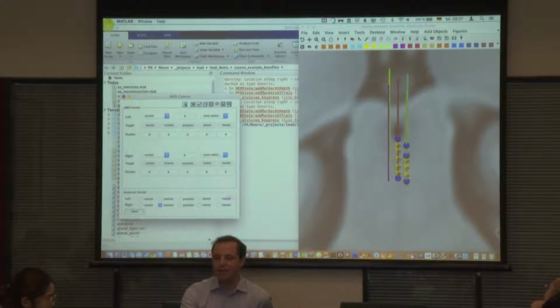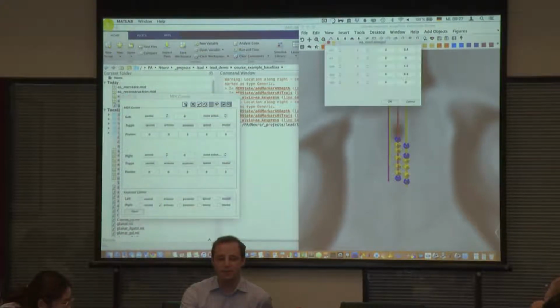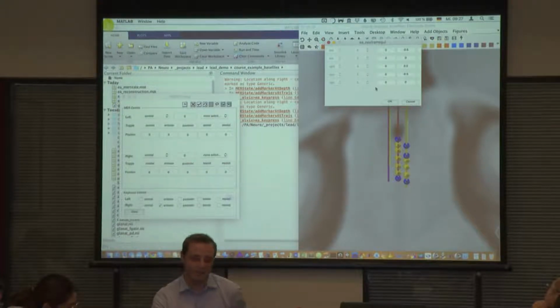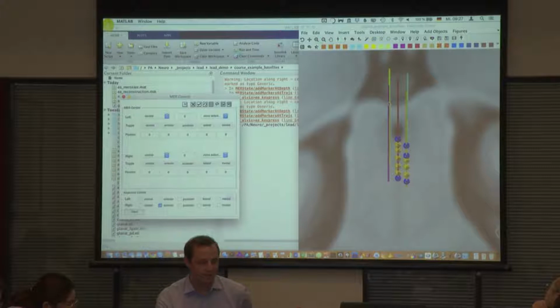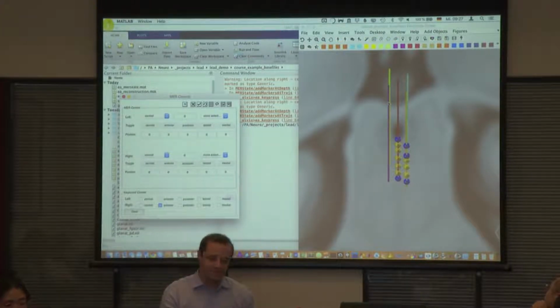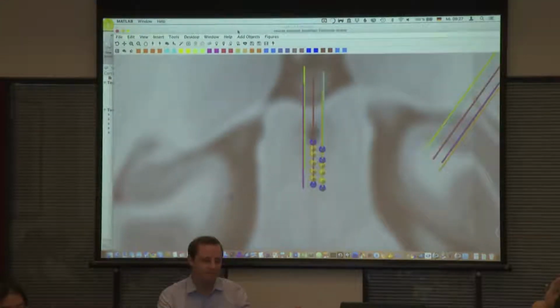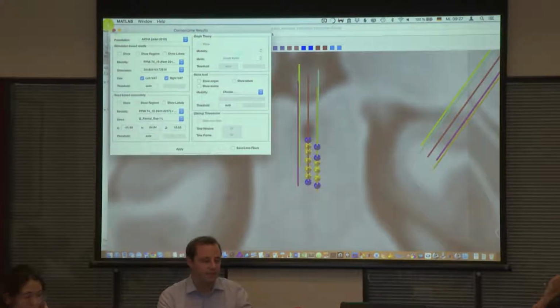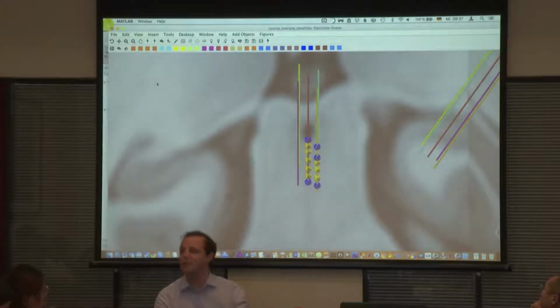I think for the people with Nexframes, but we don't have a Nexframe, so I cannot really tell you much about this. There's this button up here, the N button, and in here you can enter all of these Nexframe settings. So this might be of interest for some people. Okay, so I think this is most of the basic things from this viewer. There is also the connectivity visualization button up here, but we will cover that a bit later. And that's it for now.